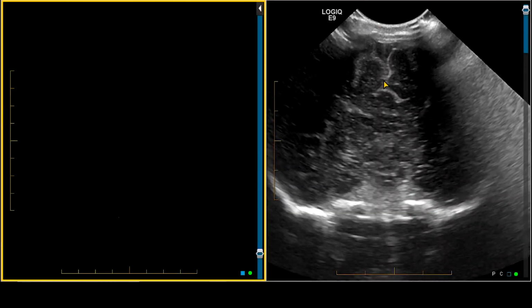This is an ultrasound of the head in a newborn infant that had an abnormal fetal ultrasound. The ultrasound was performed through the anterior fontanelle, and this is in the coronal plane. We can see sulcation here in the location where you'd expect the anterior aspect of the interhemispheric fissure. You can actually see gray matter and sulcation going across the midline. And so this is not normal. Normally, the two cerebral hemispheres do not have any sulcation that crosses over.